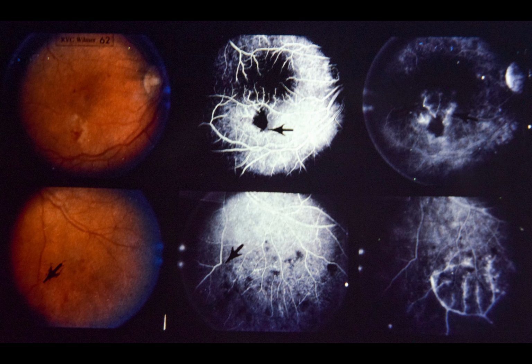She smoked 4 packs of cigarettes a day and drank 10 cups of coffee a day. But cessation of these activities was not followed by any improvement in visual acuity or appearance of the fundi. Visual acuity was 20/50 right eye and 20/16 left eye. Anterior segments were clear. Upper left, note a cotton wool spot with central retinal hemorrhage inferior to the right fovea.